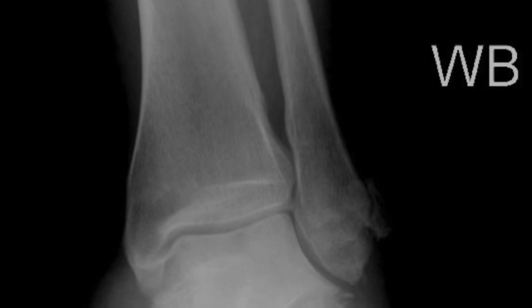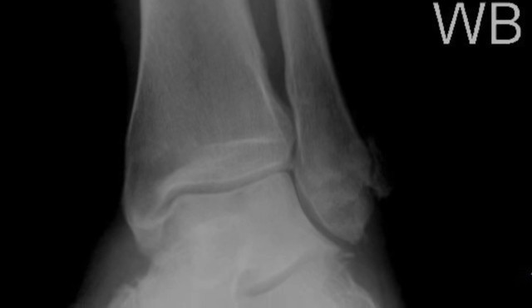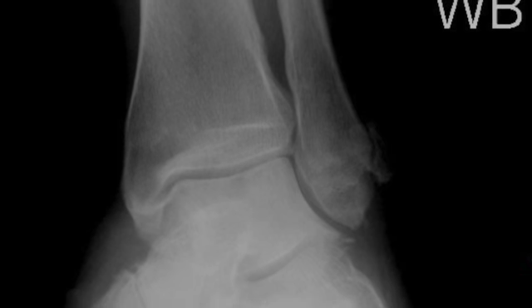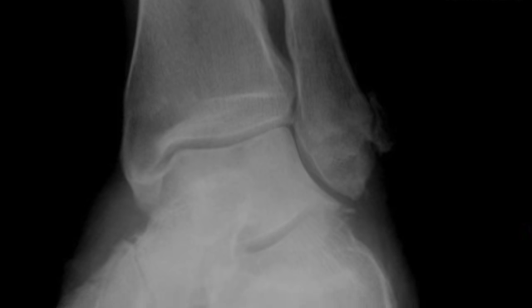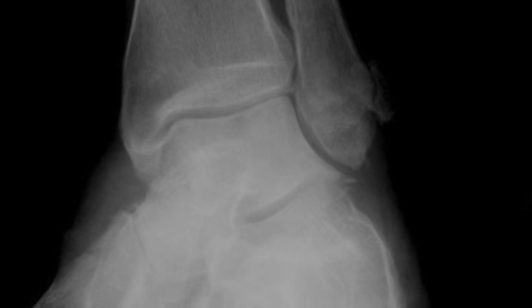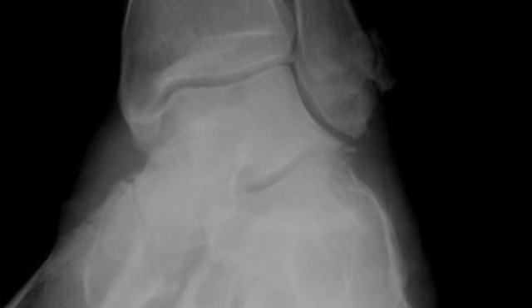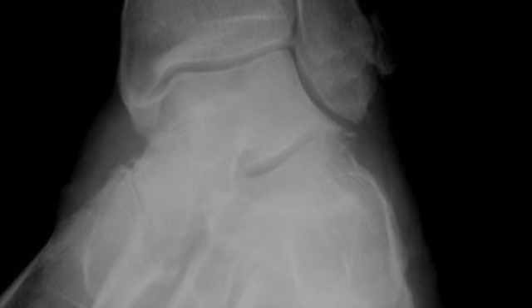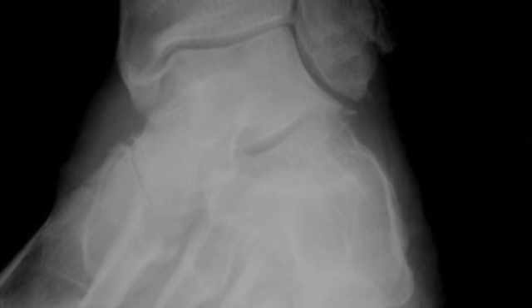In the 45-degree oblique, the medial mortise is closed and the lateral mortise is partially closed. The fibula is seen without tibial superimposition, but our radiograph shows some partial superimposition. And we have the tarsal sinus demonstrated. The calcaneus is visualized distal to the lateral mortise and fibula. The tibiotalar joint is at the center of the exposure field. The distal fourth of the fibula and tibia, the talus, and surrounding ankle soft tissues are included within the collimated field.